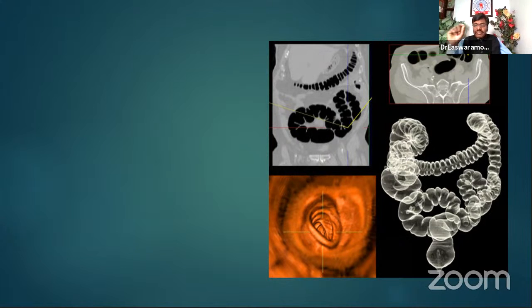Colonoscopy is an invasive investigation to find out whether the patient has a polyp or early lesions. And this is a non-invasive way of doing a colonoscopy. This is called a CT colonography. Any alternative name for this, Saranya? What is the name given for this particular investigation?